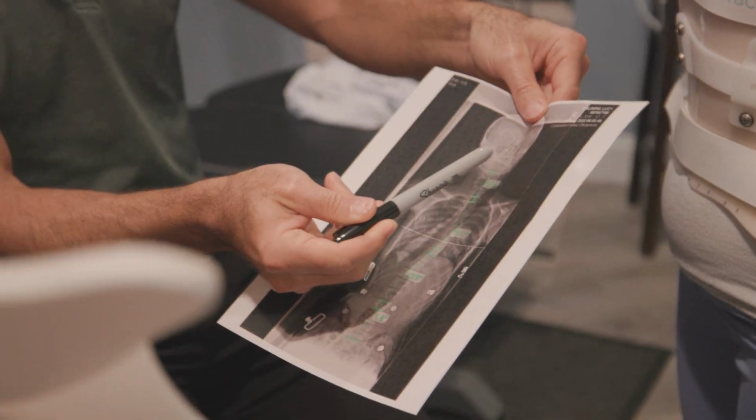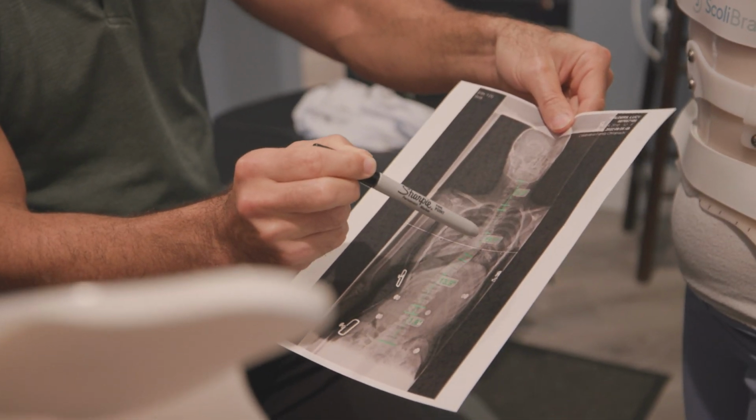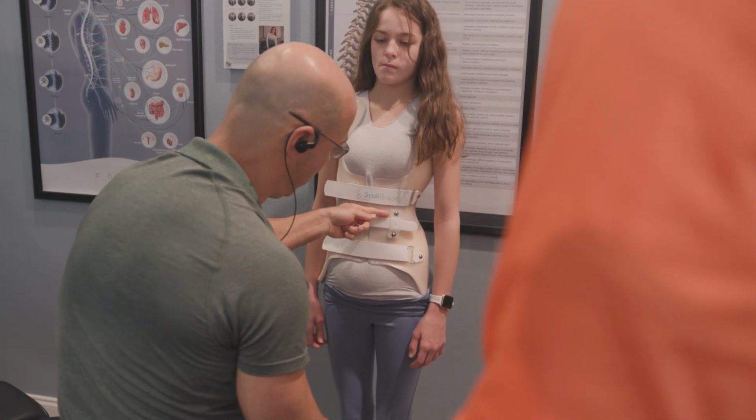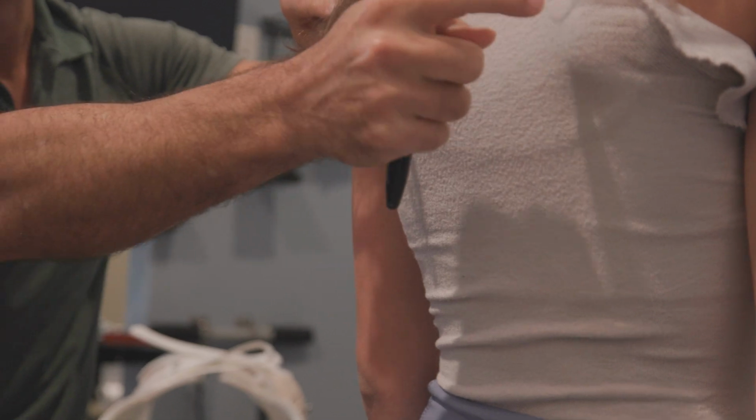And then they're never told that if the curve becomes severe, you're looking at rods and screws in your spine that are going to be in there for the rest of your life. So all these things have to be considered. So I like to treat scoliosis as soon as we find it. The way we measure a Cobb angle and where we find the Cobb angle, and when we look at all the growth plates associated with it, and whether the spine is flexible or not, these are all key factors in terms of treating a scoliosis and reducing the curve so the curve potentially doesn't progress into more severe classifications where it possibly needs surgery.